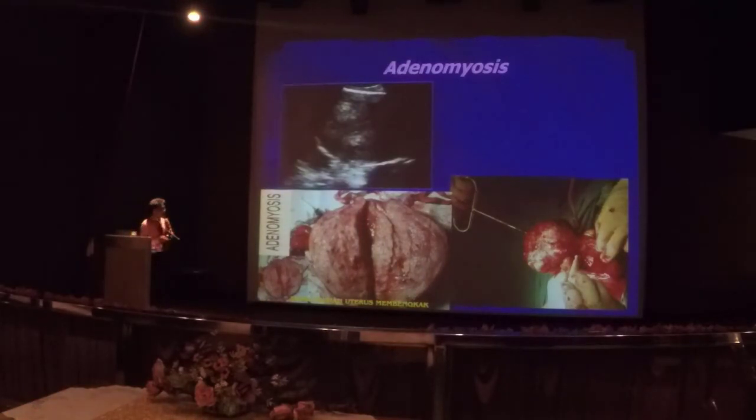If you compare with a fibroid, you can remove or detach the fibroid as it is encapsulated, whereas the uterus of a woman with adenomyosis has the whole wall globularly enlarged, because certain parts contain active ectopic endometrial tissue.